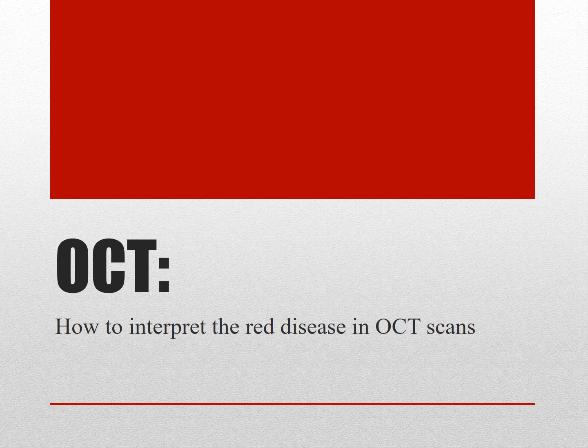Always wondering what you see on your OCT scan, but you're just not sure what it is? Well, in this video, I'm going to show you how to interpret the red disease in OCT scans.